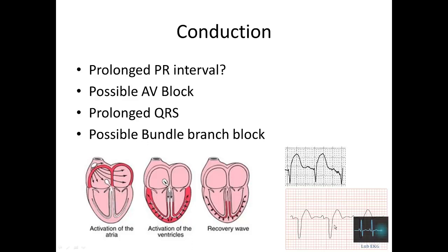Now on the second one, the one below, we see that it's getting broader, and if you consider all the way from here, it's quite bigger than half a big block. So the lower illustration is a bundle branch block. In order to determine if it's a left or right, which are the two subcategories of a bundle branch block, we have to look at what precordial leads are involved, but we will get to that soon.